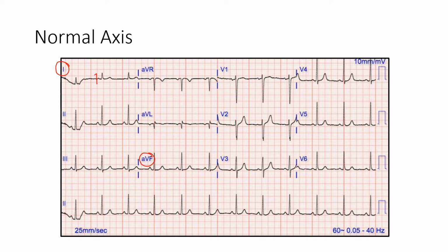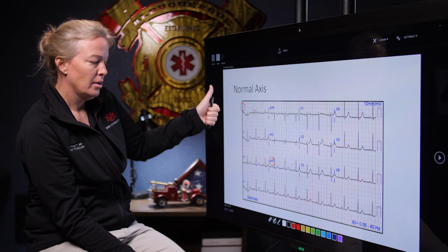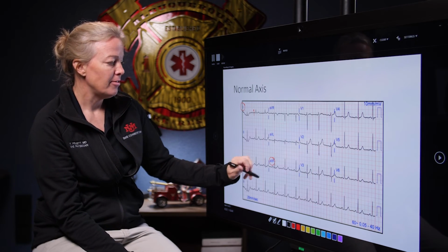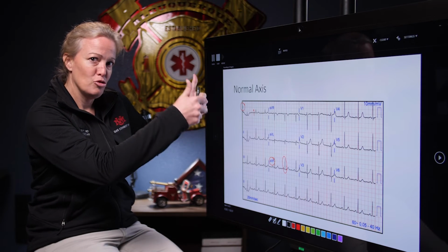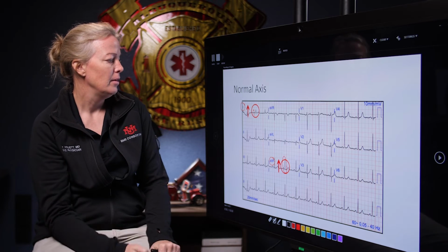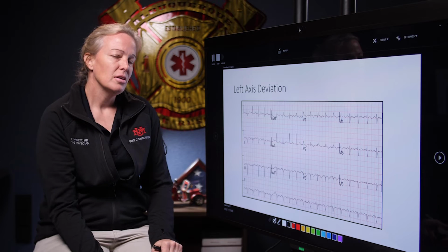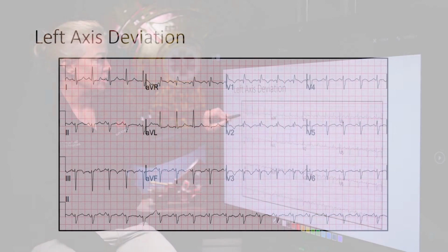It's pointing up, right? The most of the QRS is up. So since my left hand is lead 1, I have a thumbs up on my left hand, right? And then I look at AVF, and the majority of this QRS complex is up as well. And so I have up in my left thumb, up in my right thumb, 2 thumbs up. That's really good. My axis is normal, okay? There we go. Normal axis. That's good. So if we start to talk about axis deviation, which I'll explain in another talk, but first here we're just learning how to do it.